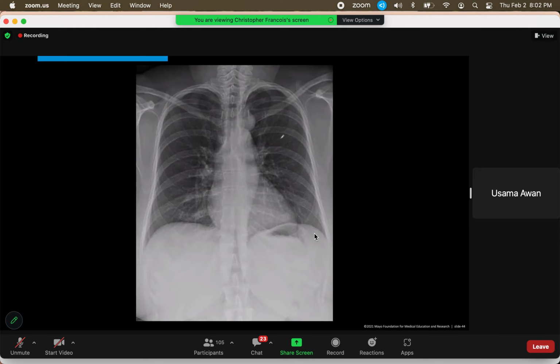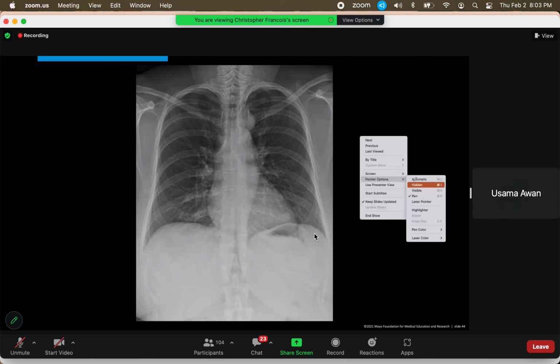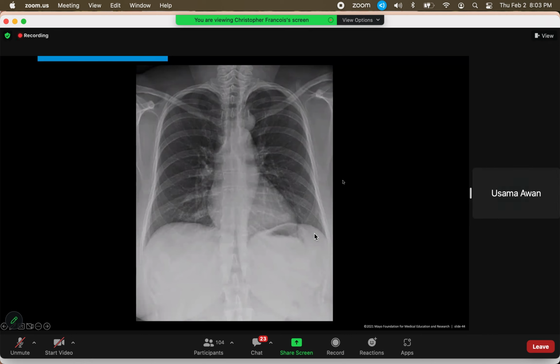So frontal radiograph, I see looks like maybe a broad-based opacity superior to the aorta on the left side, to the left paratracheal area. Not sure what that would be. Maybe pleural-based. Hard to tell.